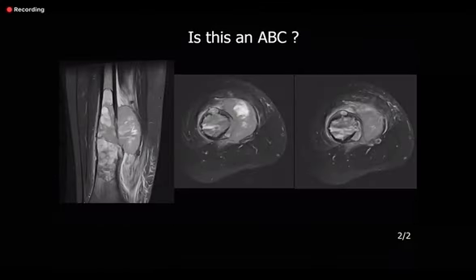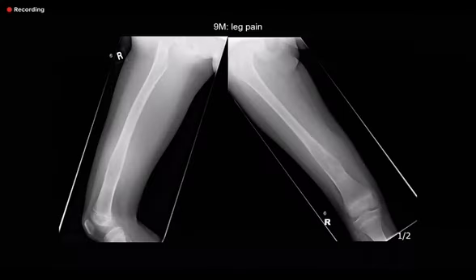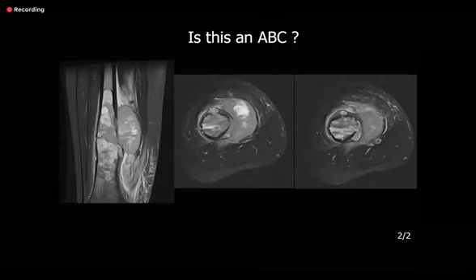So these are selected images of the MRI of the lower limb of this patient. I can see there is signal abnormality centered in the marrow and also an adjacent soft tissue mass with cortical breach. This soft tissue mass is arising from the marrow, and there are also some fluid levels seen. There's a question whether this is an ABC, but I think the overall finding points towards a telangiectatic osteosarcoma with fluid levels. Excellent.